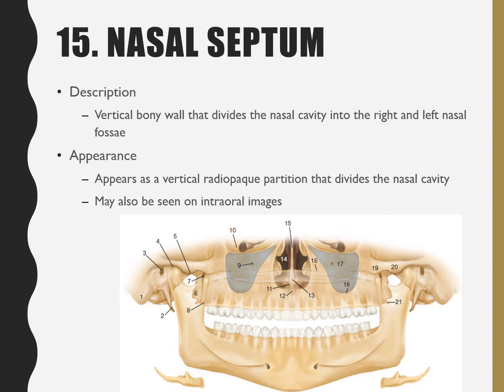I actually had one of these scares when I took a panoramic on my daughter. And it looked like this nasal septum. There was like a ghost image of it over by the infraorbital foramen. And I saw it and I was like, oh my goodness, something's going on. I don't even know how she's able to breathe. And I had that moment of, like, a parent freaking out because there could be something horribly wrong with your kiddo.